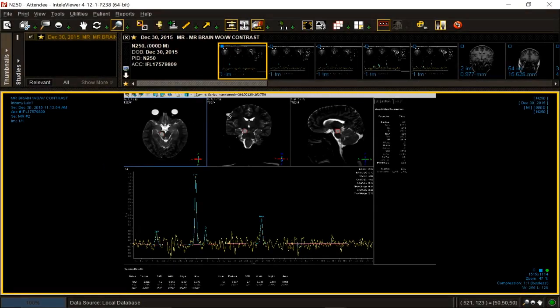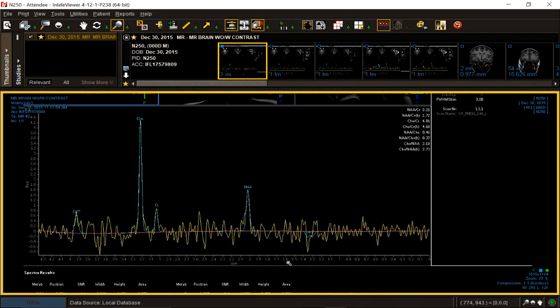It's a complicated case. It's accompanied by a spectroscopy, which shows you the spectroscopy scale. You can see in parts per million what we alluded to earlier. Lower on the right, higher on the left. So 1.33 would be the region of the lactate lipid doublet. See, just to the left of that is NAA, which is a marker for neurons. So in the area that we have selected for pixel evaluation, this would be a single voxel map, spectroscopy map. The NAA is decreased.